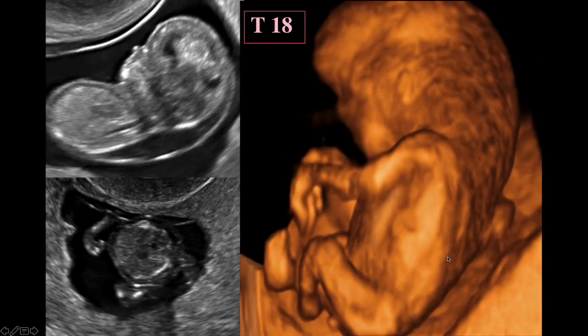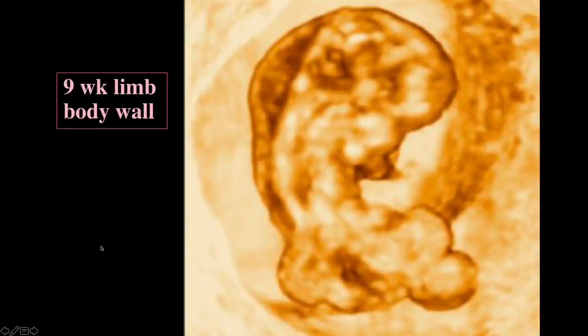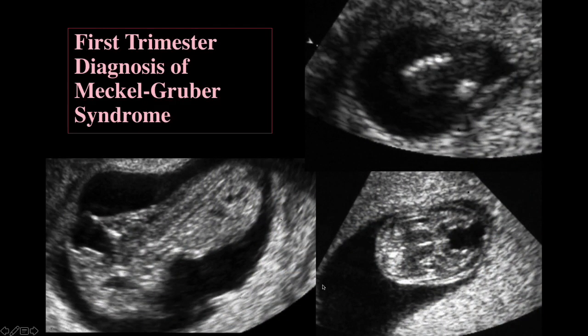This is trisomy 18. They usually have cystic hygromas. They tend to have hand abnormalities. Sometimes you can see them early on. In this case, there's sort of a clubbed hand. And then this is a limb body wall defect where you have a cystic hygroma-like abnormality, but the abnormalities are more severe on the lower part.